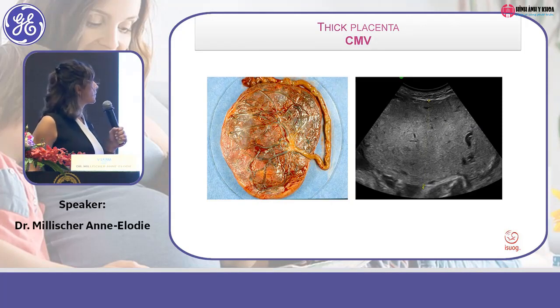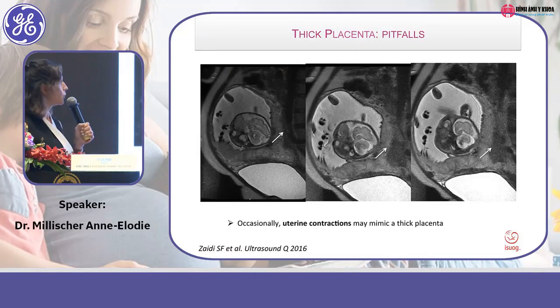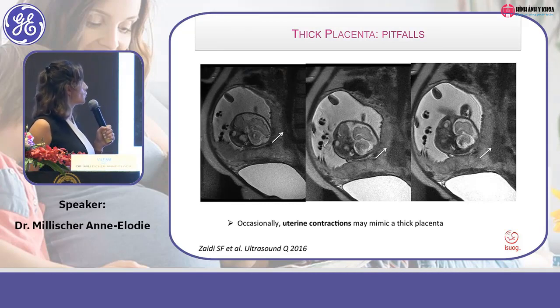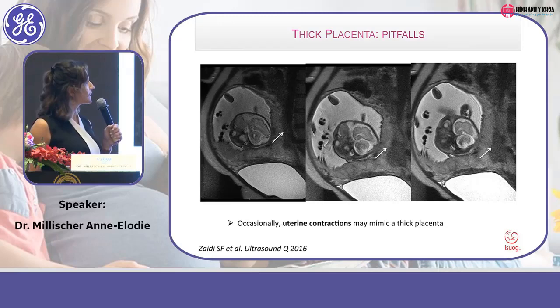Đây là một cái hình ảnh bánh nhau rất là dày, mà cái phản âm của nó rất là không đồng nhất và đây là một cái bánh nhau bị nhiễm CMV. With MRI, sometimes we can misdiagnose the fake thick placenta, which is just due to a contraction, as you can see on this picture.